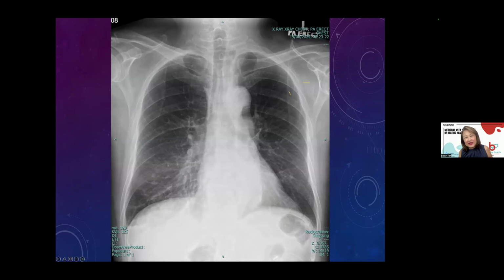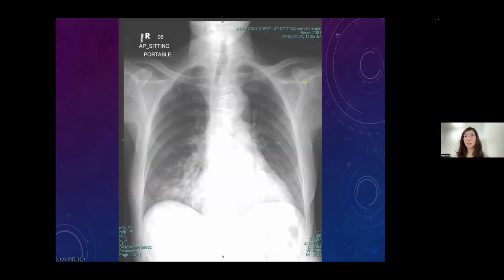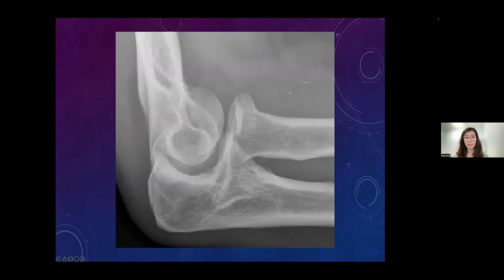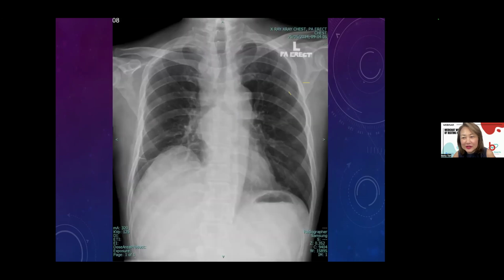Maybe the penetration also. This one also not so obvious. That's right. Yeah, this one still okay, can see. Okay, going back to our X-ray just now. So this is a widely splayed carina. At the same time, there's also right paratracheal opacity here. These are also the nodes.